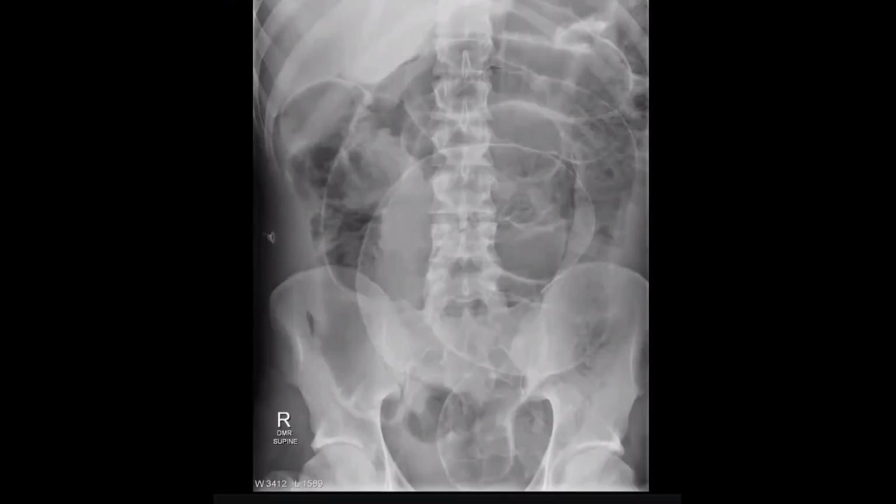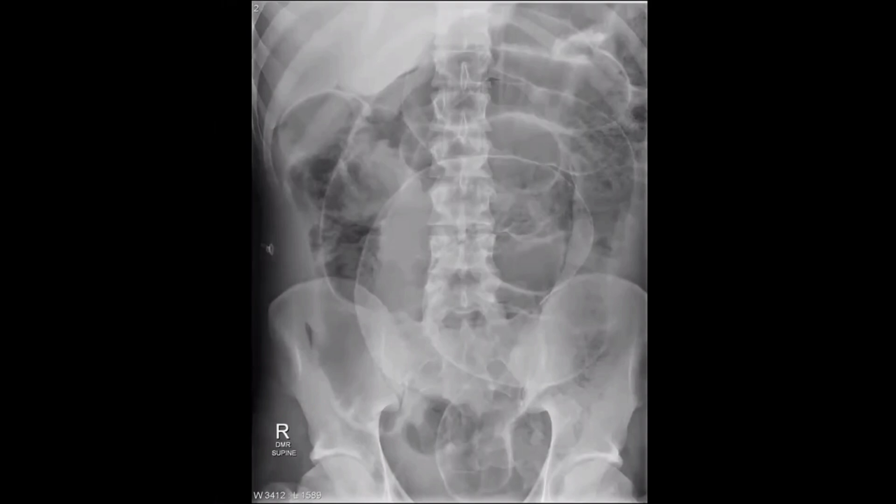I'm presented with an X-ray abdomen frontal projection of a skeletally mature patient who presented with acute abdominal pain. I can see multiple dilated bowel loops occupying the whole central abdominal cavity and also the pelvic region. There is suspicion of the Rigler sign. However, there is no gross pneumoperitoneum. But in my routine practice, I would go for decubitus views or an erect chest X-ray to rule out pneumoperitoneum. Very nice.